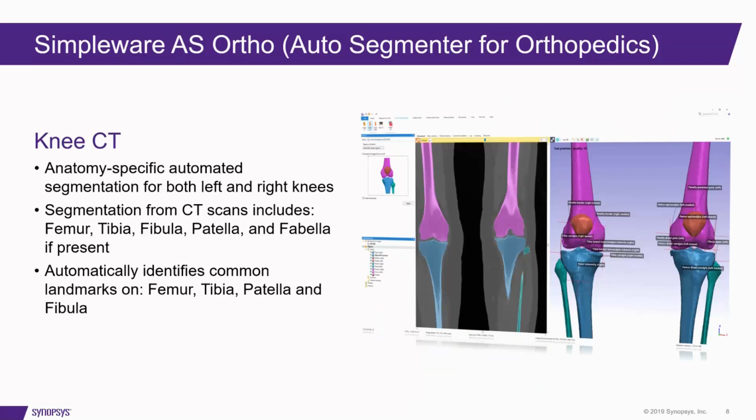demonstrating in a moment. So this tool is powered by AI technology with machine learning algorithms, and it provides a speed up of between 20 and 50 times faster as a sort of rate of segmentation. And this means that previously very tedious work is reduced or even eliminated to really free up that engineering time and computational resources, which can be used for other analysis or innovation.